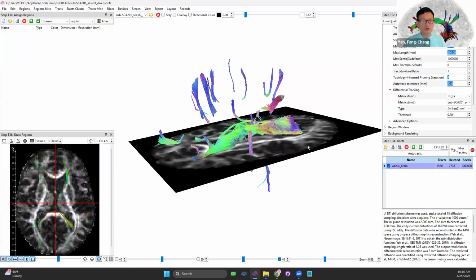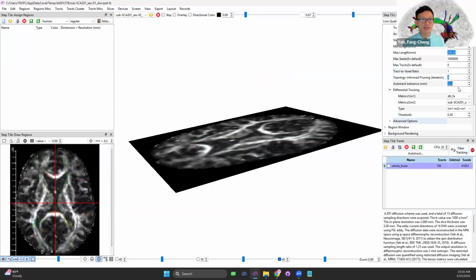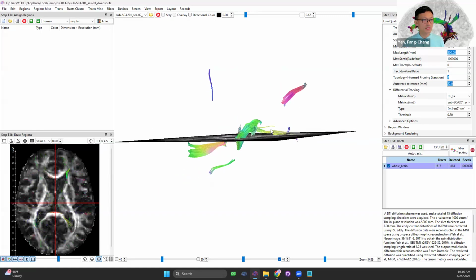If the healthy control also shows similar results, that means maybe we need to increase the threshold and make it more specific. Or we could increase the length so that we get more long-range changes, which would also be more specific. So for example, I could use this 30% decrease, and then I would get more limited results.